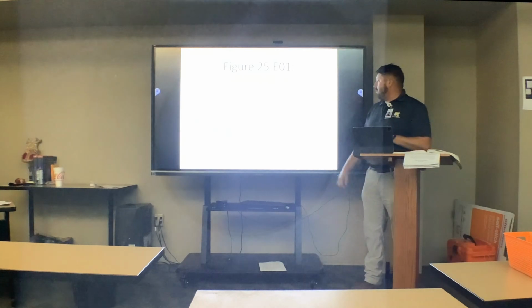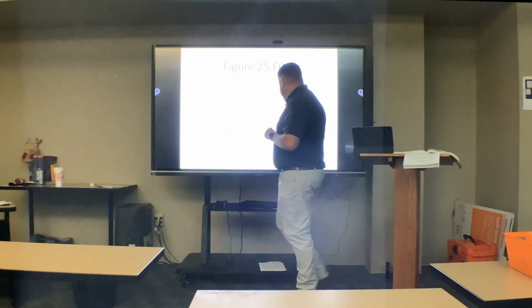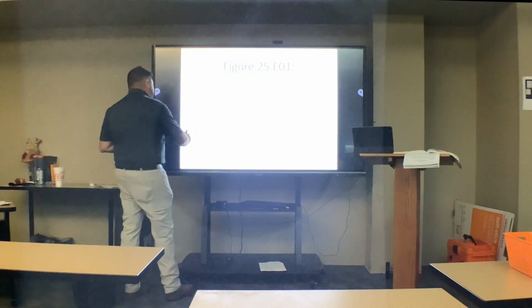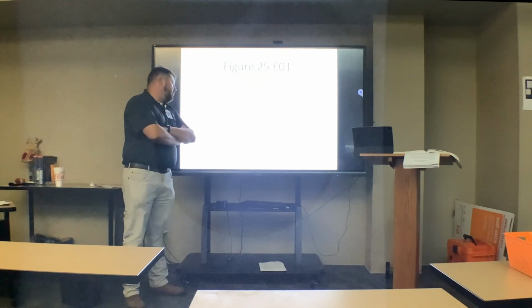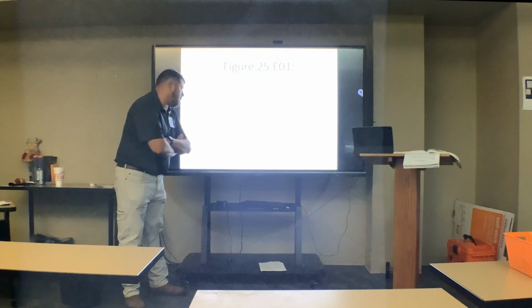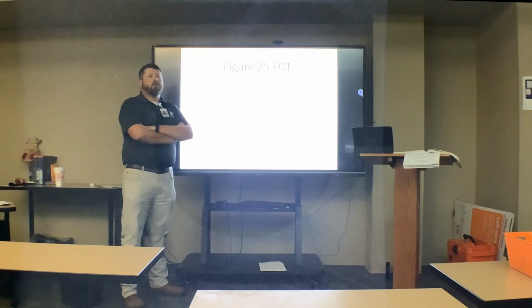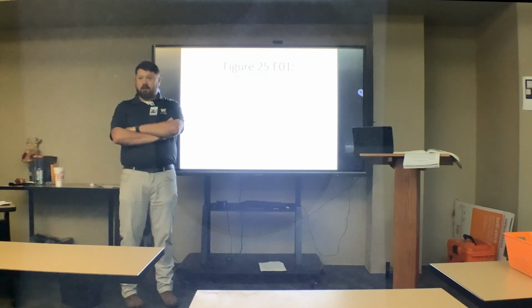All right? So this one here, we got a rate of what? 1, 2, 3, 4, 5, 6, 7, 8, 9, 10, 11, 12, 13, 14, 15, 16, 17, 18, 180. No P wave, no PRI. QRS is narrow, about 0.08 or so. So this would be an AV nodal reentry tachycardia. You can call this supraventricular tachycardia on your quiz.